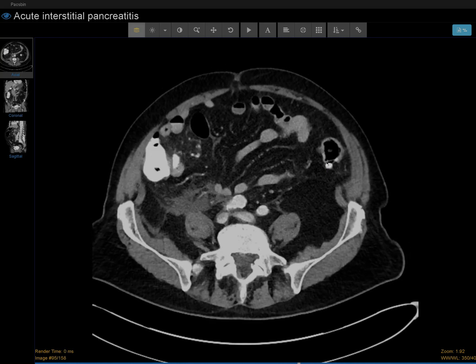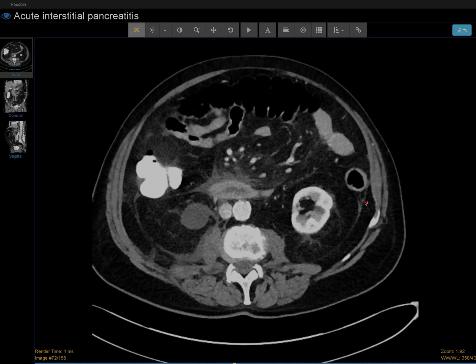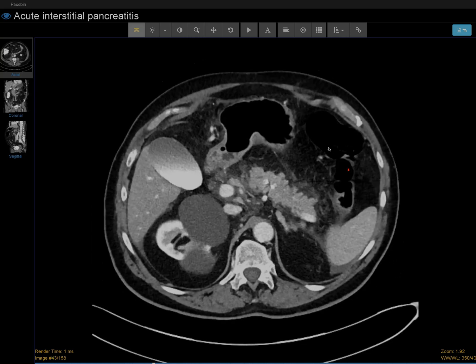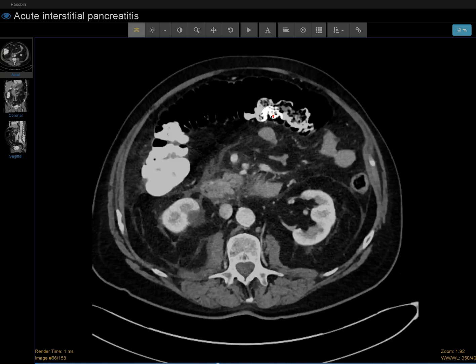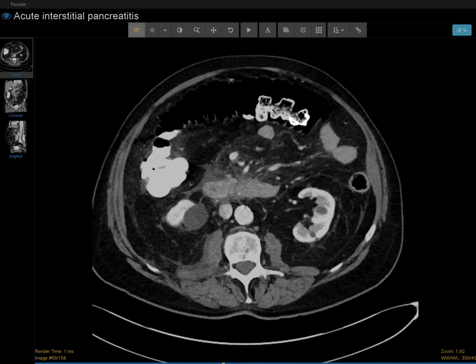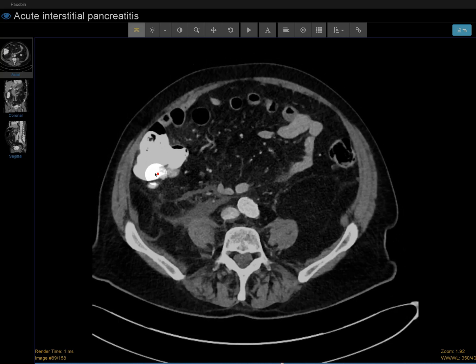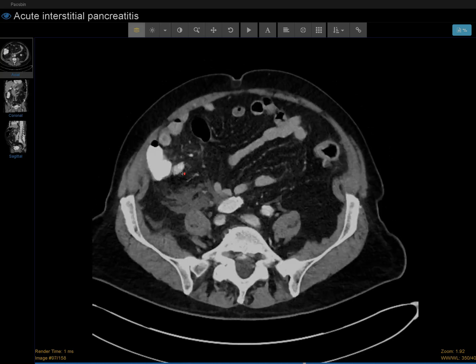And sometimes you see dense stuff in the diverticula. That is stool that has remained there for who knows, weeks, months, years, and just the fluid has been sucked out and it's just really dense. So let's go down. This is probably some contrast material mixed with bowel, because this person definitely has oral contrast. So there's my terminal ileum.